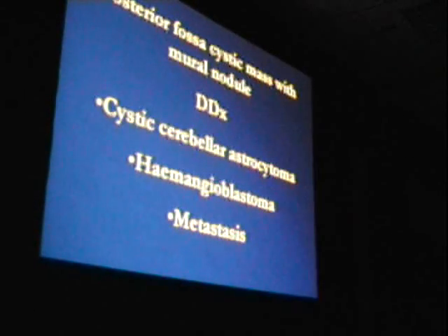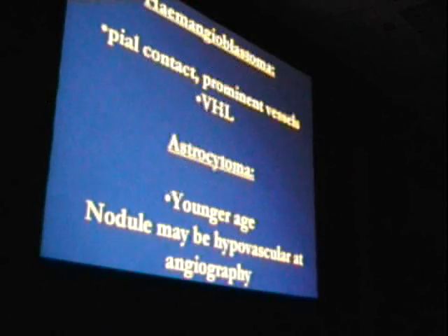So when you see a cystic mass with a mural nodule, again, there's a limited differential under the age of 10 years. Hemangioblastoma, which is more commonly seen in older patients, and obviously unusual metastases can be as well. So the features that would favor hemangioblastoma, and you're kind of around 15 or 16, you're at that kind of where it could be.